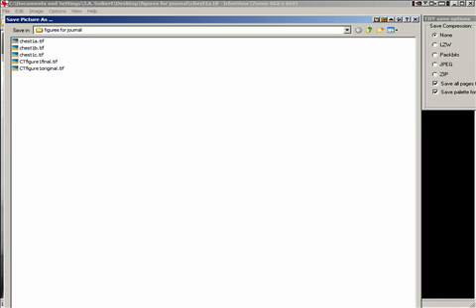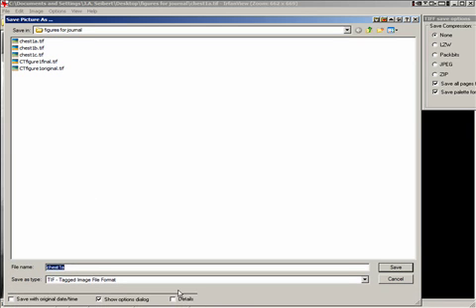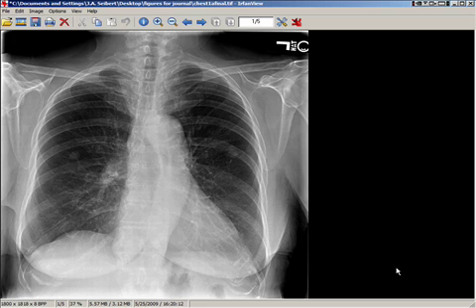And for this example, we will save as chest 1A final.tiff. And we'll do this for the soft tissue and bone-only images as well, although instead of using a 6-inch width, I'll use a 3-inch width.